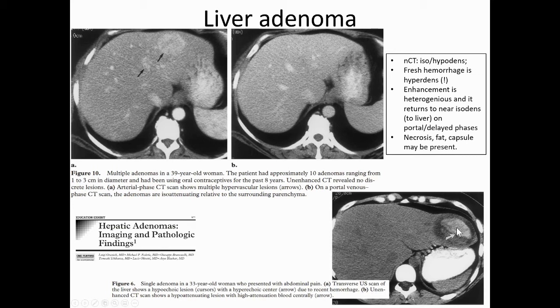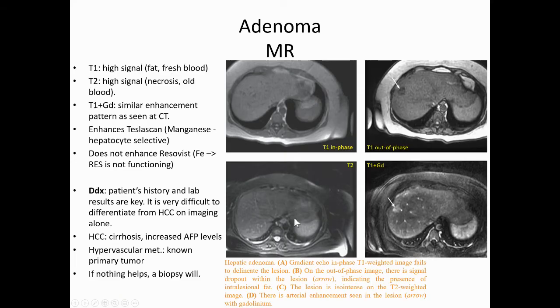And if there is fat, then you can also make that visible by putting a region of interest over the area and measuring the density of the lesion. Adenomas on MR is a little bit more powerful in the sense that it allows a much more objective way of assessing for fat. For example, there is a specific pair of series, the in phase and out of phase series, which if you read concurrently, then you can diagnose fat very objectively.